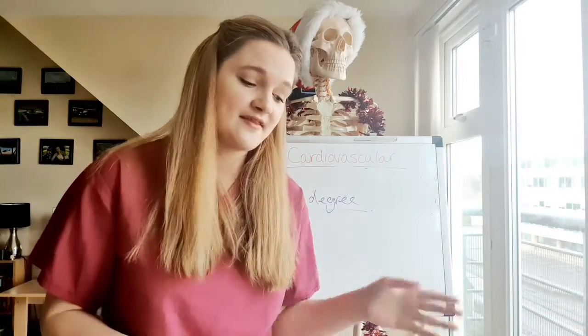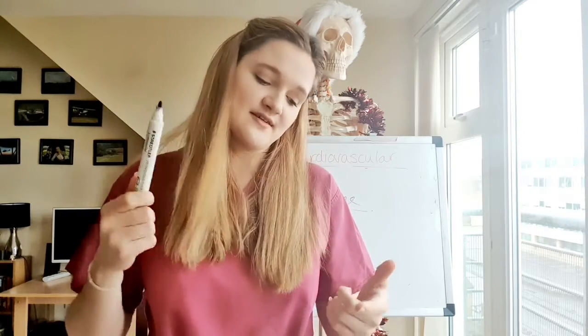Okay, so they're the three that I wanted to take you through, and we had a look at a normal ECG earlier as well. We've gone through the electrical conduction, and that has pretty much summed up our quick bonus lesson for the weekend on electrical conduction and relating it back to ECGs. We've looked at first degree, two second degree and third degree heart block. Hopefully that clears up some stuff for you.